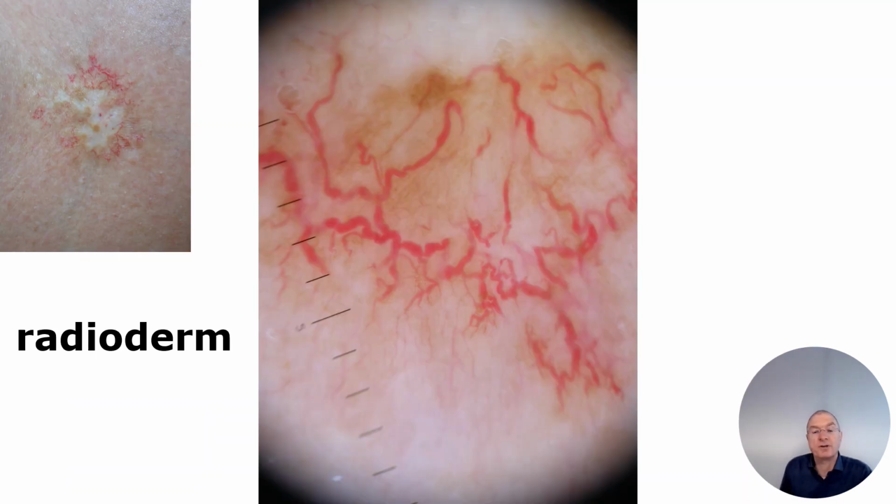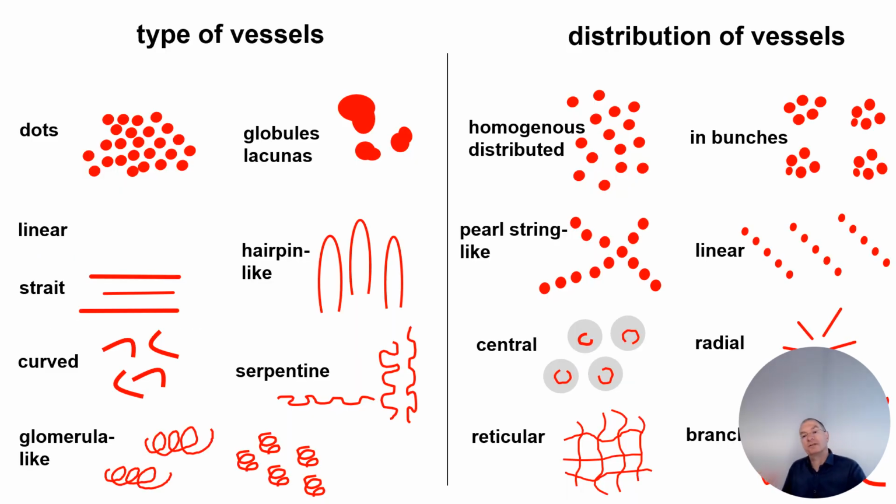Also here, a scar after radiation, for example, for an angioma in childhood. So tricky vessels at the periphery are these vessels of the BCC. If you doubt, take a biopsy or just check if it is a nice regular pattern. For example, you can also take one or two images and check it again after two to three months, and you will see any difference in the BCC. So just to have this in mind.